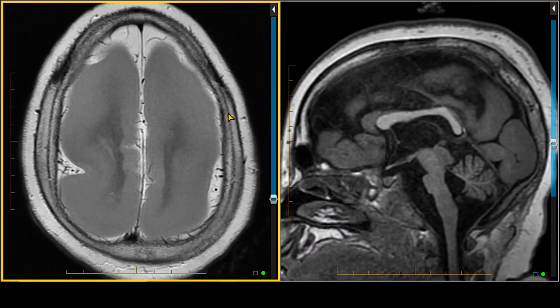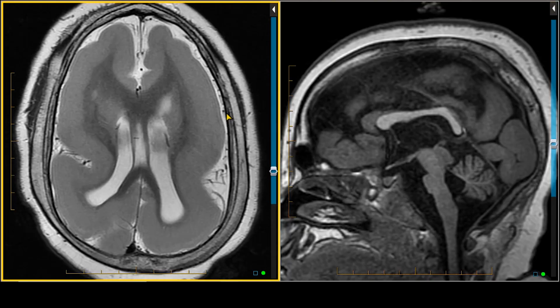This is an MRI of the brain in a child with seizures and developmental delay, and we can see a severe paucity of sulcation. The brain surface is relatively featureless. We see a very rudimentary Sylvian fissure here on the right, and a shallow version of a similar structure here on the left. So otherwise, it is very featureless.